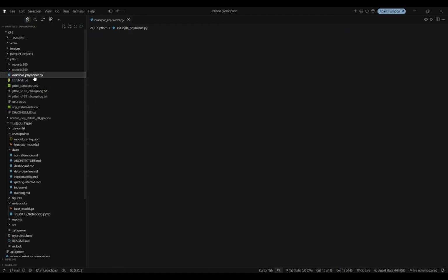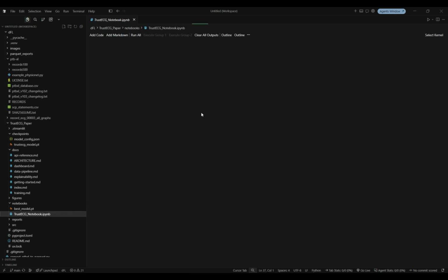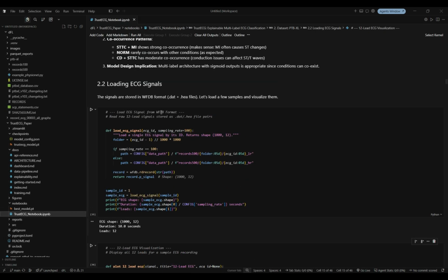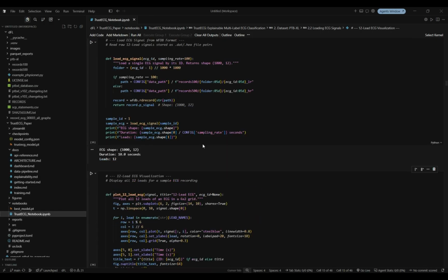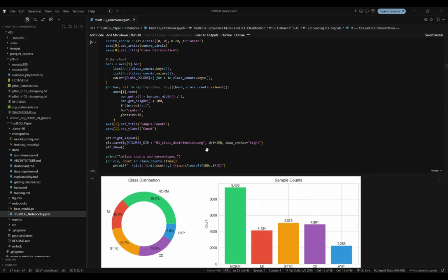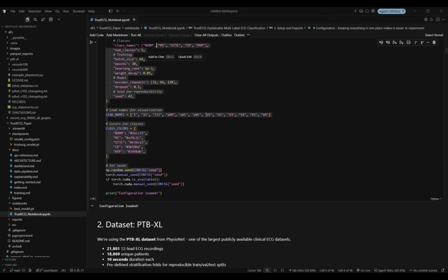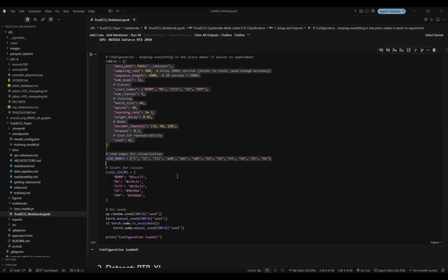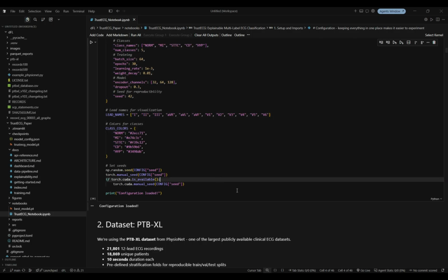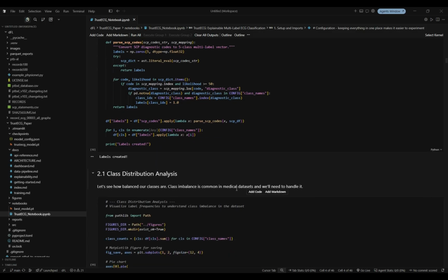Now, the way I was doing this before was everything in Python scripts. I had a script to convert the raw ECG files into Parquet format using WFDB and pandas, a separate script for plotting, another one for trying out different pre-processing steps. And every single time I wanted to change something, say, adjust my bandpass filter from 0.5 to 40 Hz to maybe 1 to 35 Hz, or try z-score normalization instead of min-max, I had to go into the script, find the right line, change it, and rerun everything.